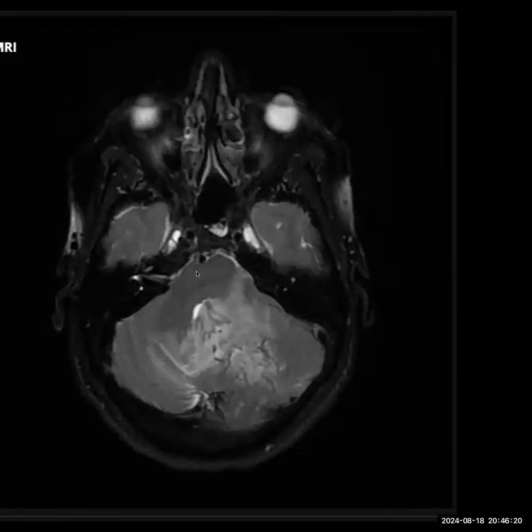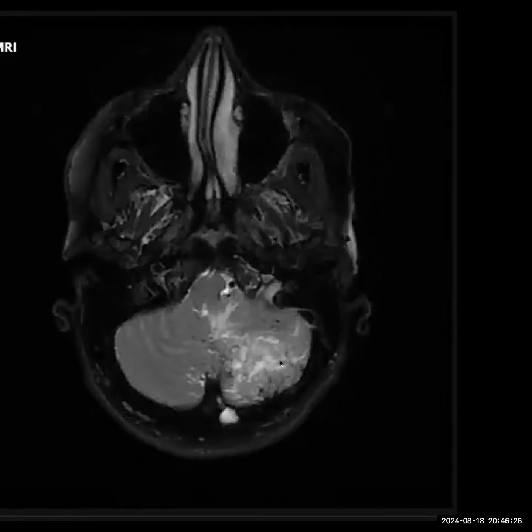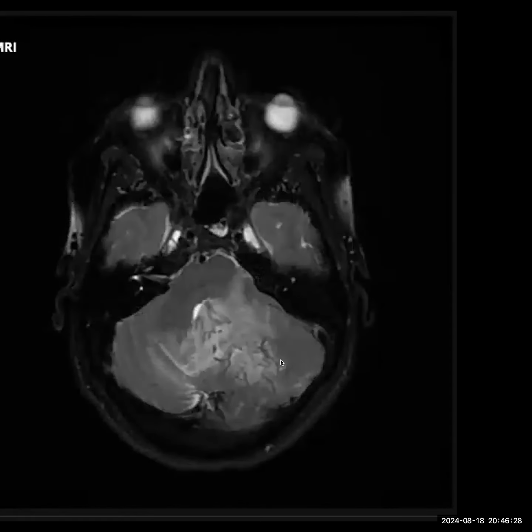Von Hippel-Lindau. Epididymal cyst is very common in the testis. And when you see flow voids in the background of this, you should think of hemangioblastomas. I totally understand it's not very easy, you can give a set of differentials, but when the examiner is trying to narrow you down by giving you additional clues, please, it's perfectly fine.